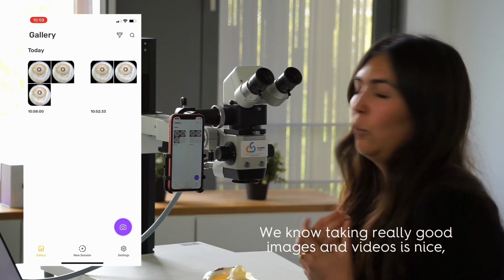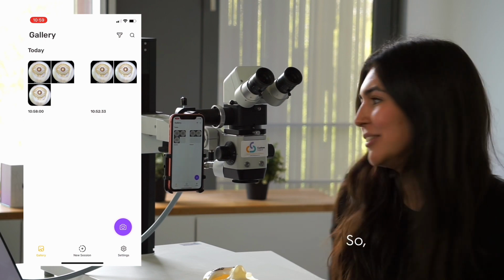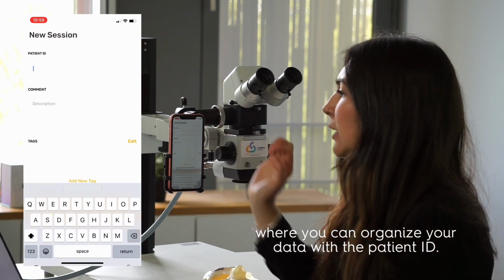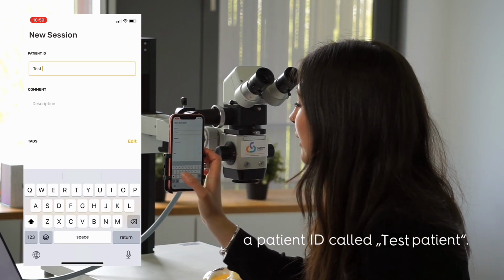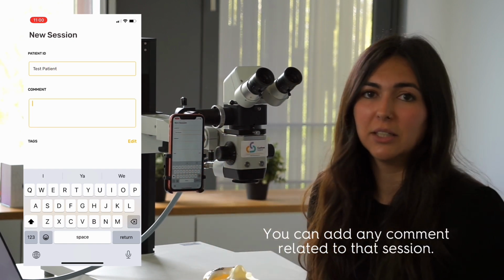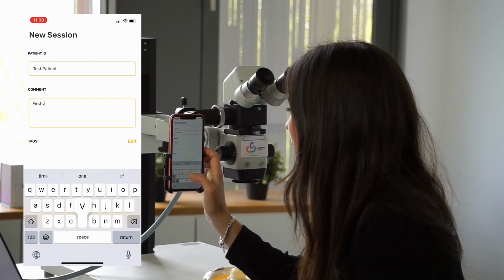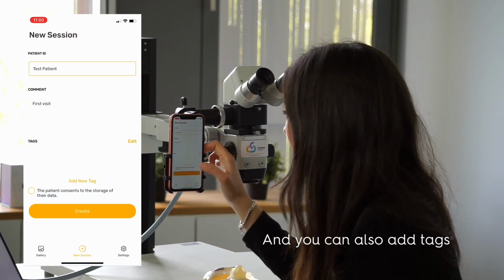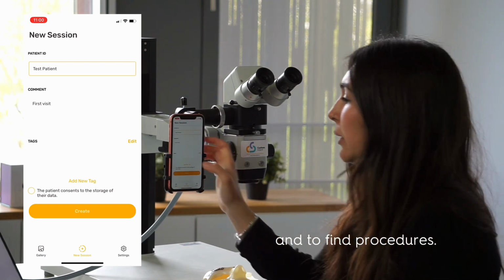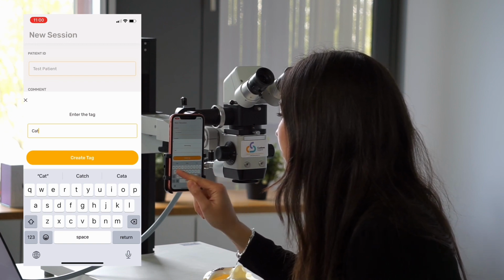So we know taking really good images and videos are nice, but trying to find the right recording can be hard. So basically we allow in the MicroREC app to create sessions where you can organize your data with the patient ID. We're gonna create, for example, a patient ID called test patient. You can add any comment related to that session. So for example, first visit or anything that is useful to you. And you can also add tags to be able to search and filter later on and to find the procedures later. So we can write here, for example, cataract.